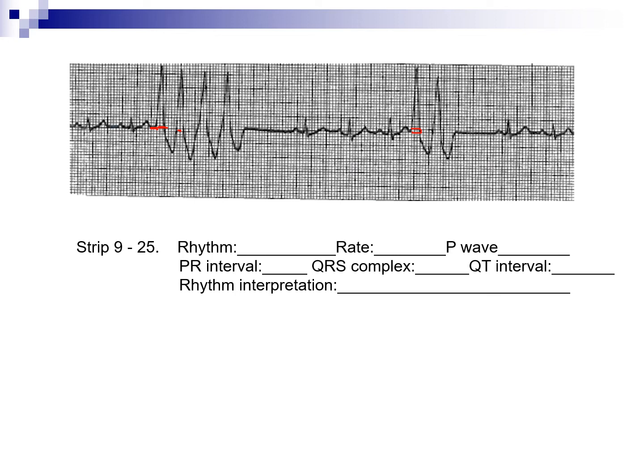QTs, we're doing the QTs on the basic rhythm. So from and bottom. And so the interpretation is QT is 0.28 to 0.32. So the interpretation is that you have baseline of a sinus rhythm, but you are having a 4-beat run of V-tach and a couplet of PVCs.